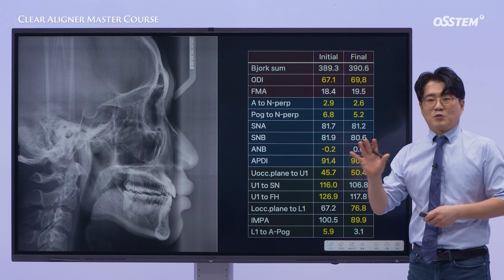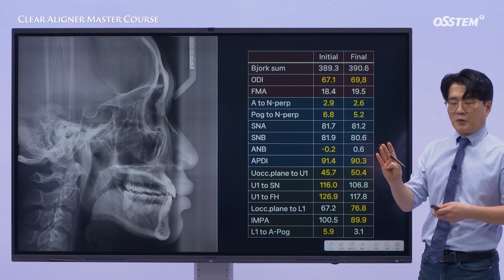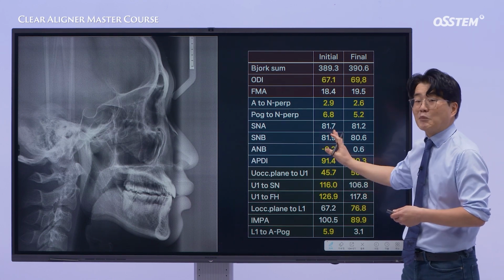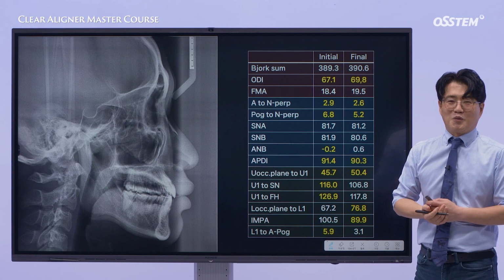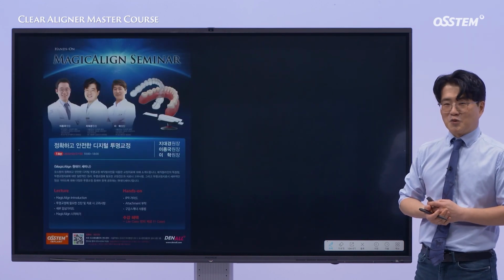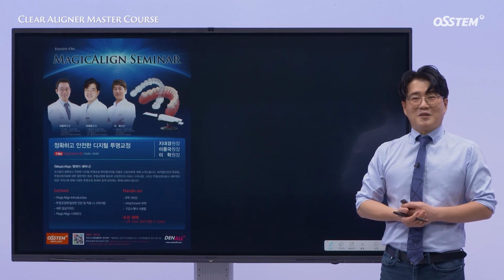In addition, this case includes features commonly seen in Class 1 crowding, such as deep overbite, crowding-related rotations, and other associated aspects. I hope this case was helpful and informative. Did you find it interesting?